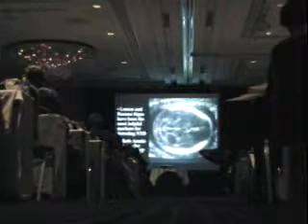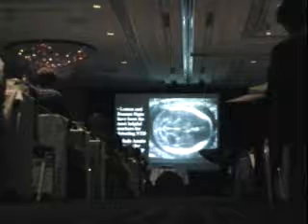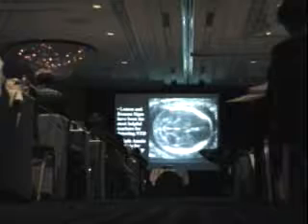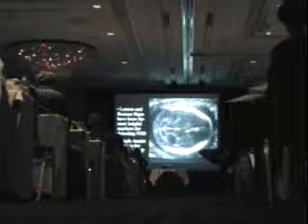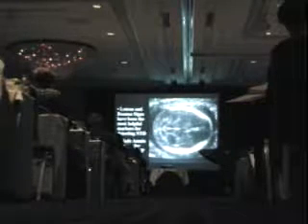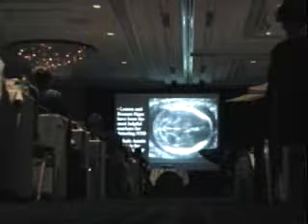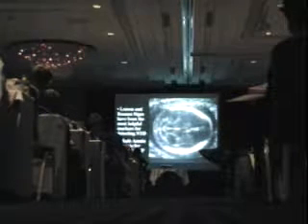But it's very important to also look at the spine and look at the defect within the spine. We'll show you some examples of that in a minute. The lemon and the banana sign are an important set of signs that were put in the literature a good long time ago, at least 15 years ago, and are extraordinarily helpful for the detection of neural tube defects. Open spina bifida can be very subtle. Little tiny defects in the sacral region or sacral lumbar region can be very hard to detect. And yet, open neural tube defects almost invariably have signs in the fetal head that indicate that they're there.